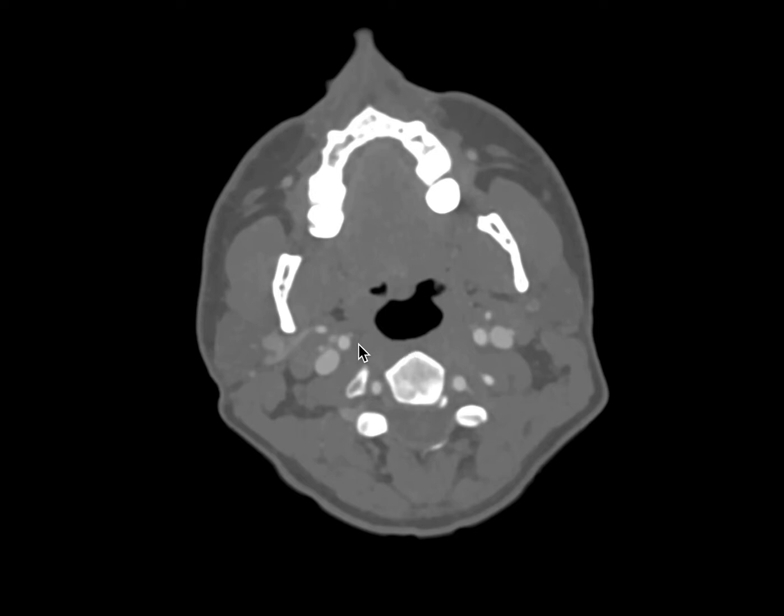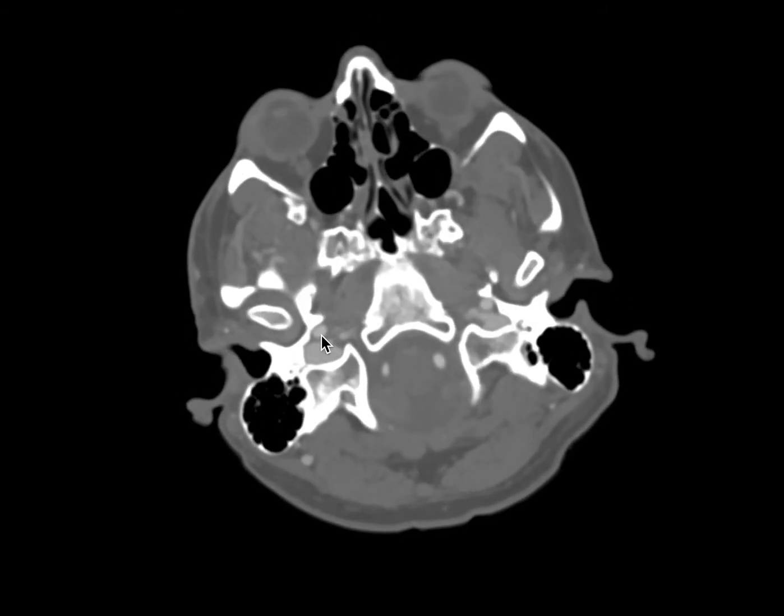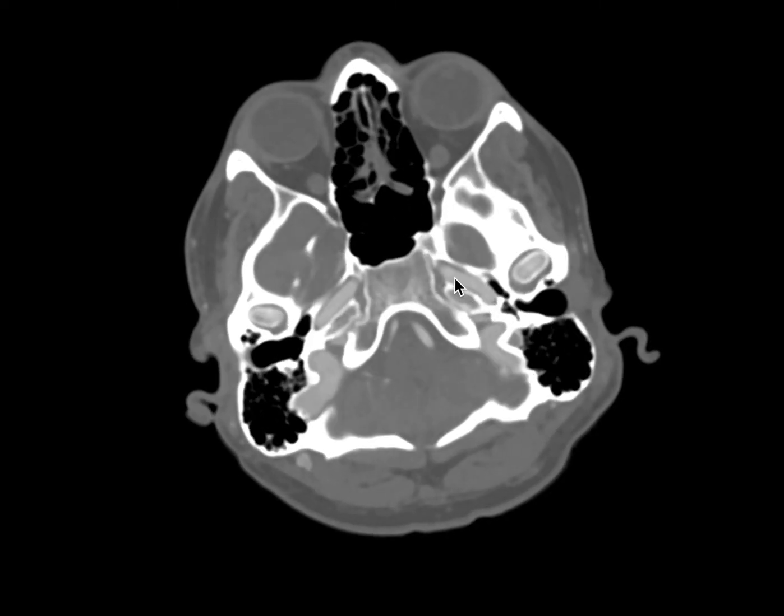We'll now continue to follow our C1 cervical segments superiorly until they enter the skull base up here at the level of the carotid canals, seen here on the right or here on the left. At this point, they'll transition into the C2 or petrous segments. This is the first intracranial segment and will course anteromedially, like so.